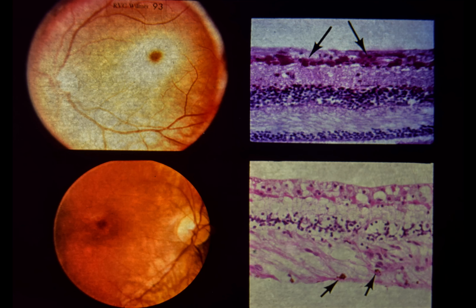Lower left. This 13-year-old male was well until 1 year previously, when he began to develop progressive mental deterioration, convulsions, and myoclonus. He recently began to have visual difficulties. Visual acuity was approximately 20/80 OU. The right optic disc is normal. The macula shows extensive pigment abnormality in a bullseye pattern. Lower right. The patient died 6 months later. The retina shows extensive loss of both neuroepithelium and pigment epithelium.